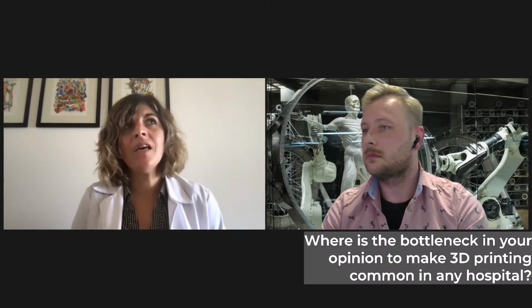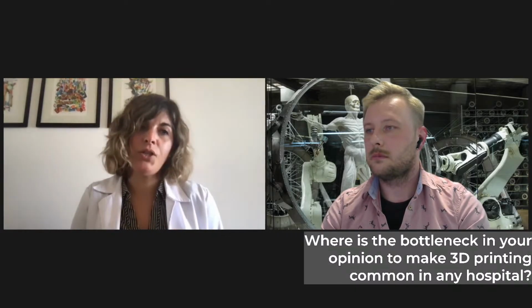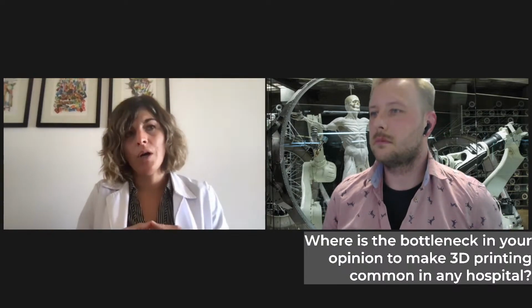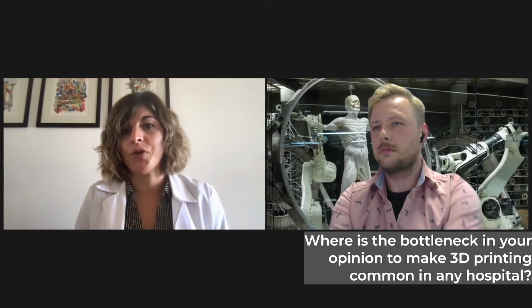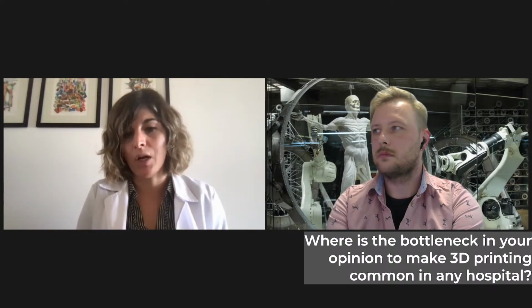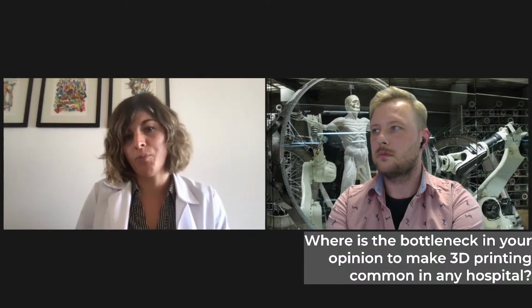What is the bottleneck? Okay, so for that, I would like to say one thing, which is don't wait to have a 3D printer to start using this technology. Because as I was telling you, in our hospital, most patients don't get to 3D printing. We just stop at the part where we have the virtual 3D model, because that is enough sometimes to plan a very complex surgery. Okay, so that's the first part. Everybody should start using this technology because it helps a lot. And sometimes you don't even need the 3D printer.